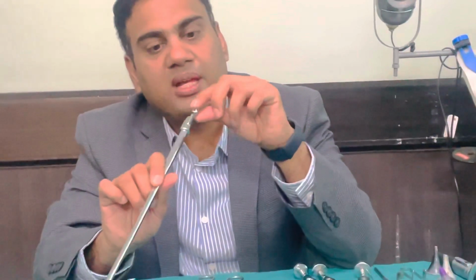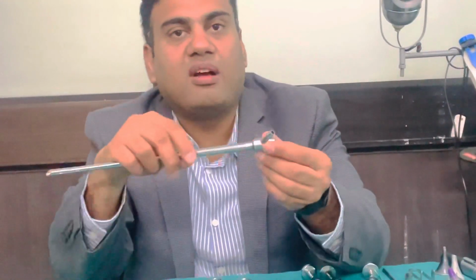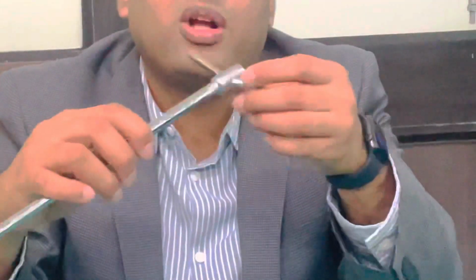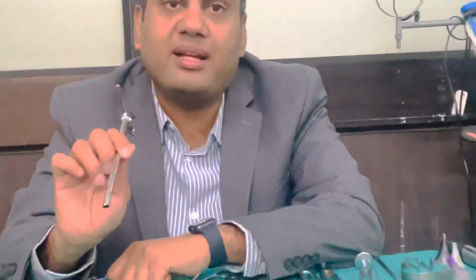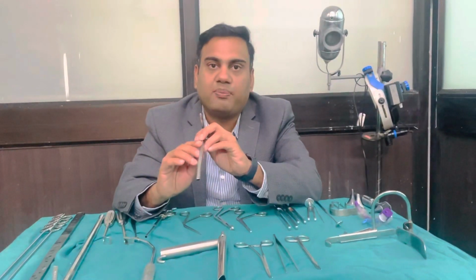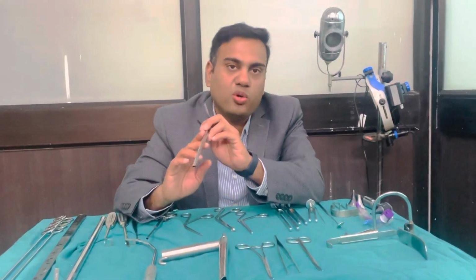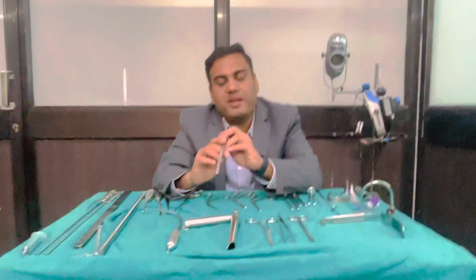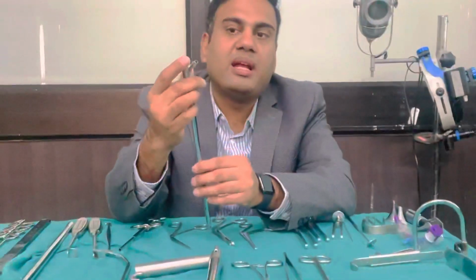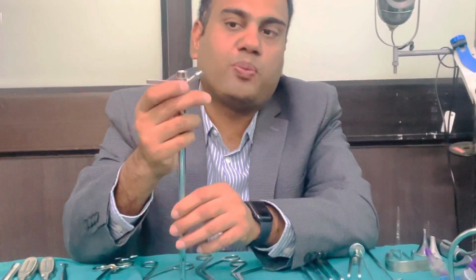Also, the other end, that is the end that is towards the surgeon, there is going to be a vent for venturi. Venturi is for jet ventilation, for giving the air or oxygen. Because remember, when we are doing bronchoscopy, we are sharing the airway with the anesthetist. There is no intubation. The scope is placed in the larynx and then it goes in the bronchus. So how will the patient breathe at that time? The anesthetized patient will breathe through the oxygen that is given through this part of the scope, that is the air ventilation end of the bronchoscope.